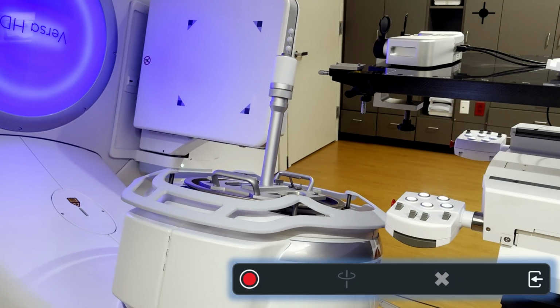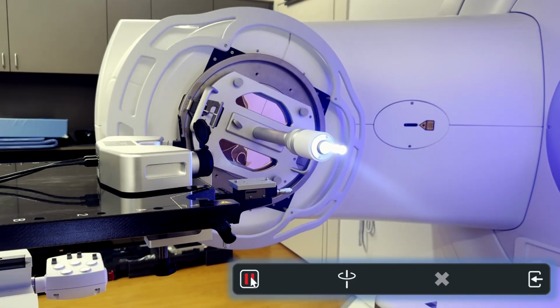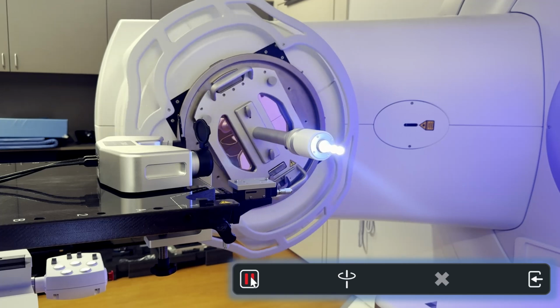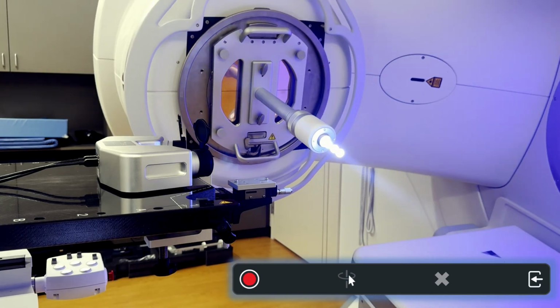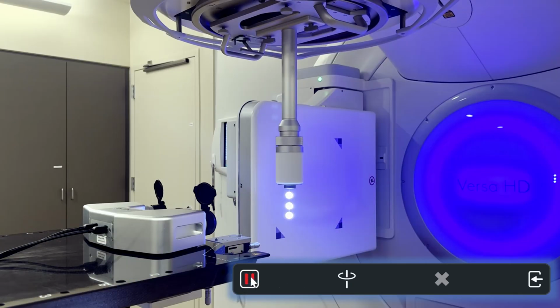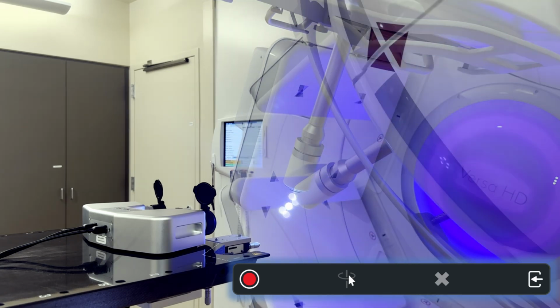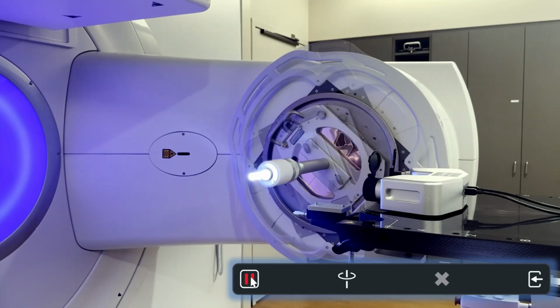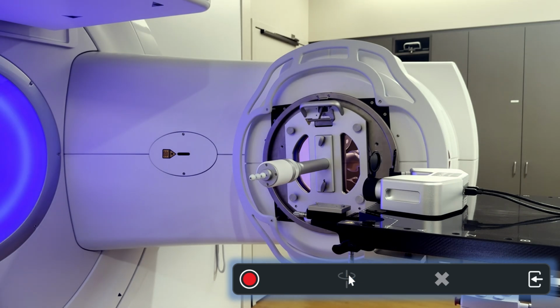Set the gantry angle to the next measurement and then repeat the measurement process. First clicking the Record button, then rotating the collimator fully, then clicking the Save button. Continue until all measurements are complete. Once the iMarc dataset is fully measured, your physical isocenter will be automatically computed and its radius will be conveniently displayed in the session tree. Remember, physical isocenter will serve as our landmark for isocenter optimization. The couch axis of rotation and the radiation isocenter will be set to this important location.